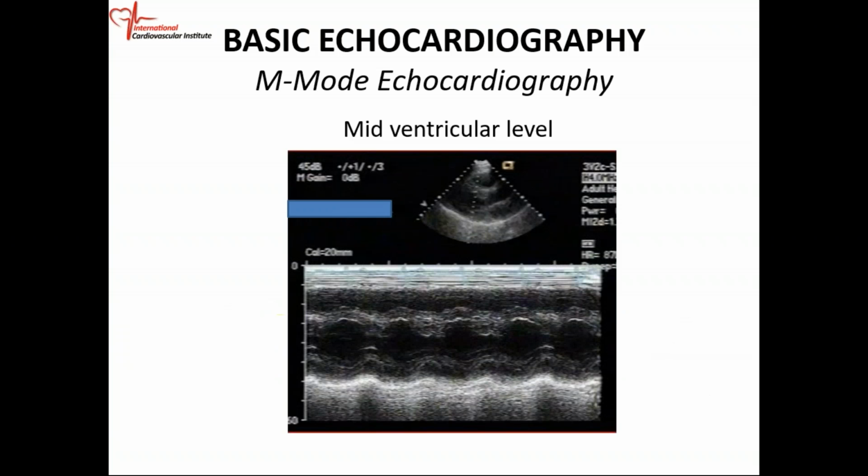If we're going to measure the septum, remember, and again, this is an exam type thing, septal thickness is measured at the onset of the QRS, in diastole. So you look where your ECG is, at the onset of the QRS, you measure the septal thickness. You measure your LV cavity size in diastole at the onset of the QRS.